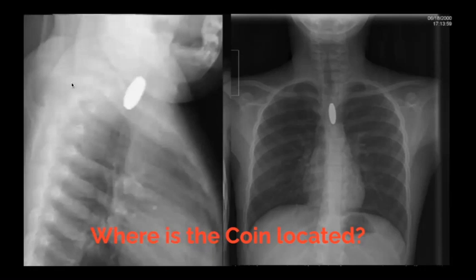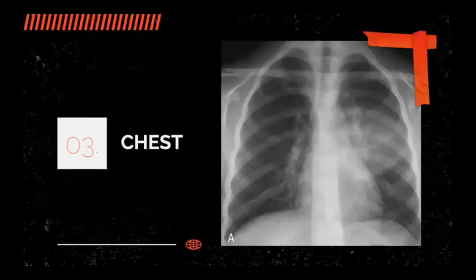But in this case, on the first patient, we have the privilege of a lateral radiograph, so you can see the coin projecting almost posteriorly, almost at the level of the vertebral spine. So basically this is located much more posteriorly, so it's within the esophagus. All right, so we move on to the next chapter, which is the chest.